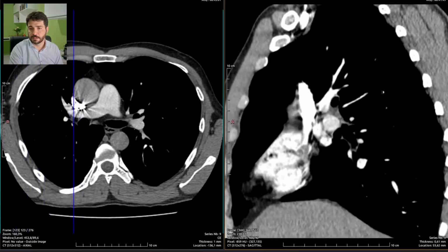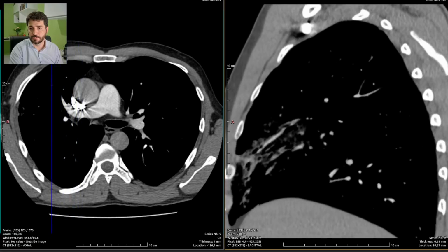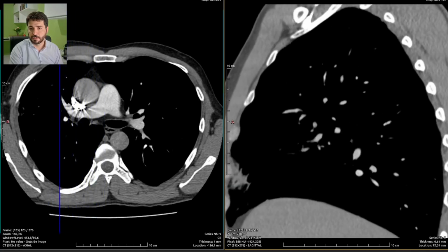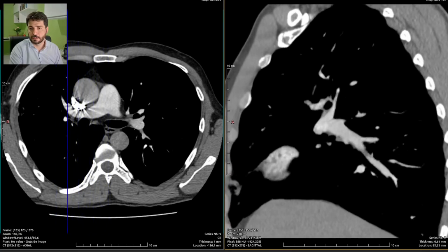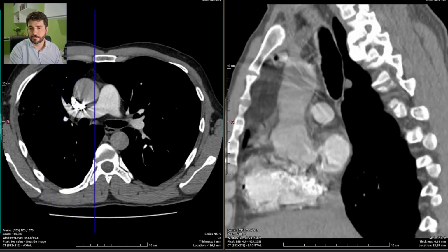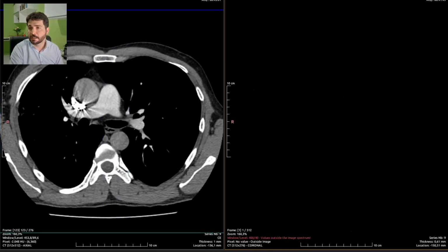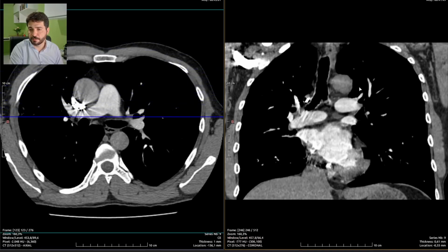This is very nice to look at, because this is a patient who clearly isn't suffering from a severe breathing syndrome. He can hold his breath long enough to make a proper exam, which usually isn't the case with patients that are suffering from acute arterial pulmonary thrombosis.